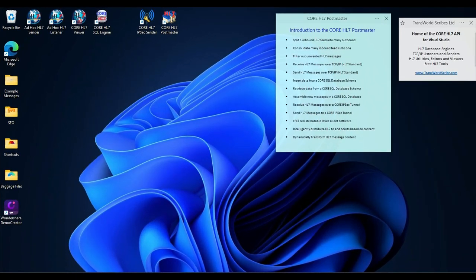Today we're doing a video about the CORE HL7 Postmaster. This is a hard video to get started on because this product does so much. We're going to try to give a brief overview of what it can do, but we won't be able to show everything. Perhaps we can make future videos. I'm going to invite you to pause this video for a second and read this list, and then we're going to get started.